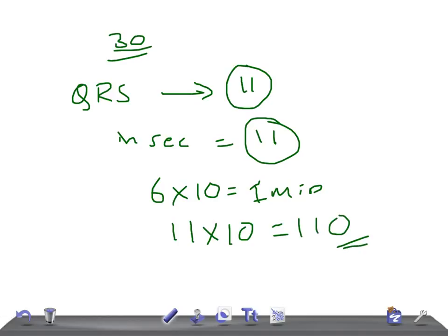This is how you calculate the heart rate on EKG. This is really a tachycardia, right guys? So this is how you have to calculate heart rate on EKG.